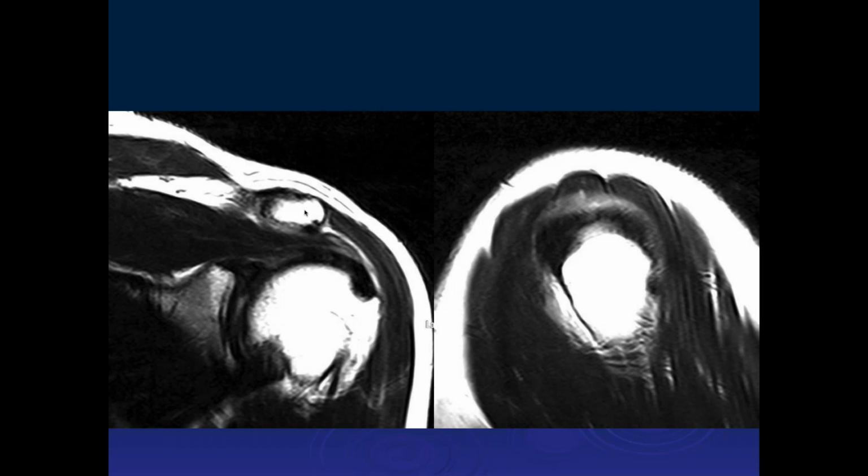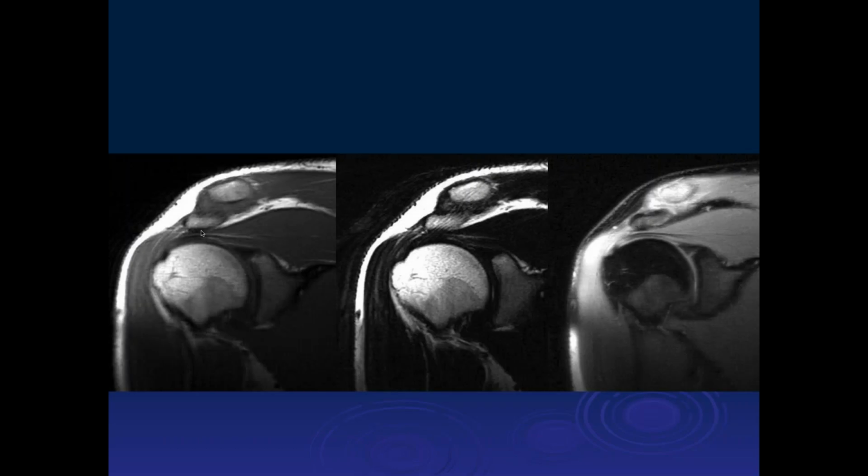So here's another example. Here we can see the acromion. We can see irritation and increased signal intensity along the superior aspect of the supraspinatus tendon right at the musculotendinous junction. But what's abnormal here is notice if we go back to most of the rest of the cases that the musculotendinous junction typically is located right about the 12 o'clock to 12:30 position of the humeral head. If it's more retracted than this, that's abnormal.